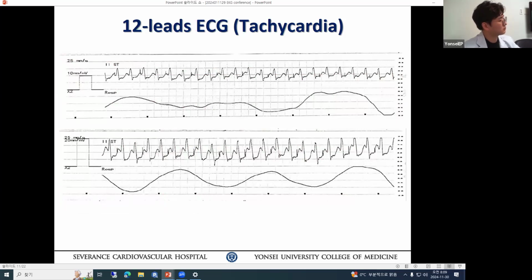I don't know about the ventricular pacing, but these possibly could be ventricular pacing also, but we can't tell for sure unless by interrogation. Or you can say, whatever this pacemaker is doing, it is not capturing and not sensing. Tachycardia is going. Okay, so it has to be faster than the pacemaker programmed rate. That is another argument against the pacemaker.